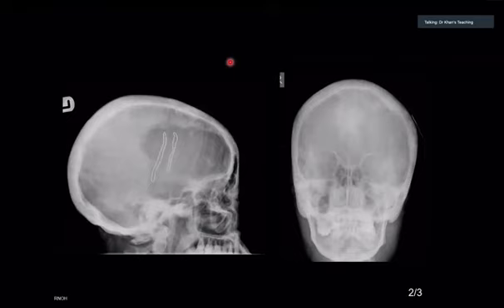Now, the key thing in Paget's disease is the concept that it has three phases: lytic, sclerotic, and mixed. People make many mistakes because they do not pick up the lytic phase very well, so remember that it can be lytic. There is more osteoclastic activity, then osteoblastic activity, and there can be a mixed type. Enlargement of bone is what we are talking about.